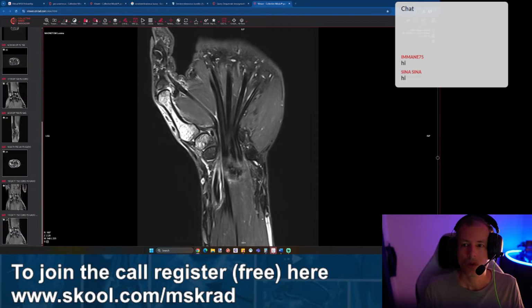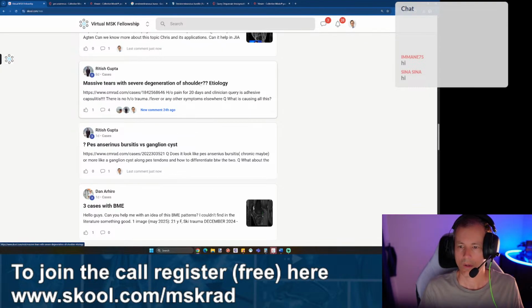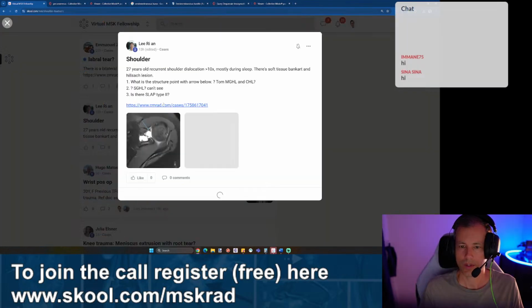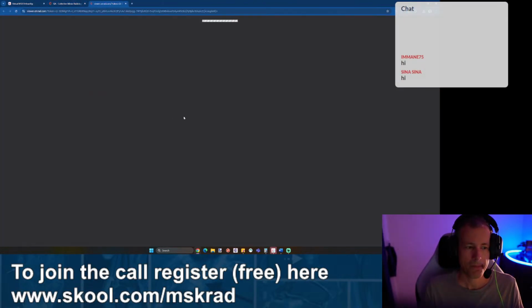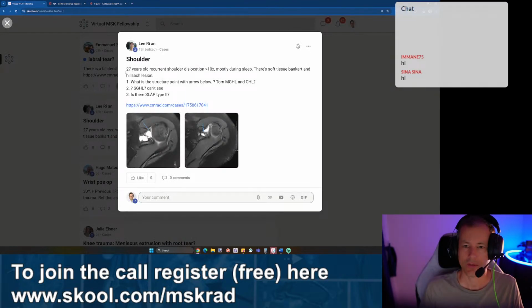Okay, so then let's go here. Let's just pick another case. So we did this one, massive tear, I think we covered this, shoulder. So let's go here to Ryan's case and open this. Okay, so it's loading. Let's have a look at the question.